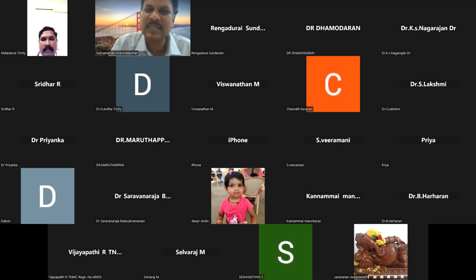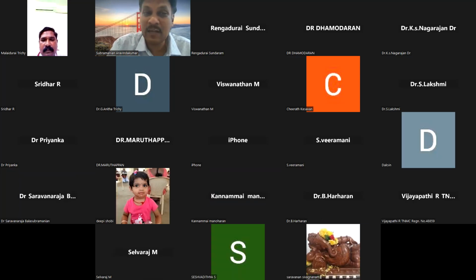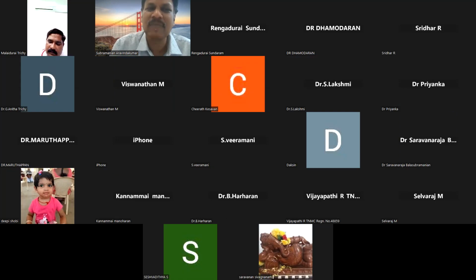This is what the LVH, whereas in hypertrophic cardiomyopathy, you will have a curved ST segment, deep T wave inversion of more than 10 millimeter, mostly 5 to 10 millimeter, whereas here in LVH, the secondary STT change, you will have less than 5 millimeter. So everything is different, totally different between LVH and HCM, sir.